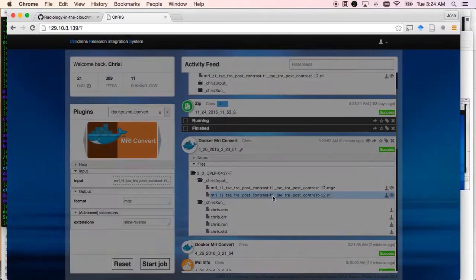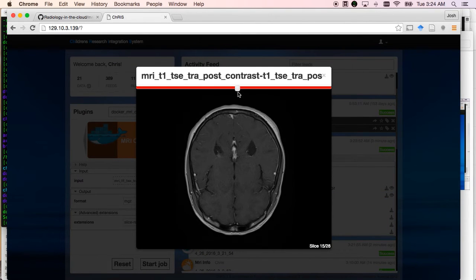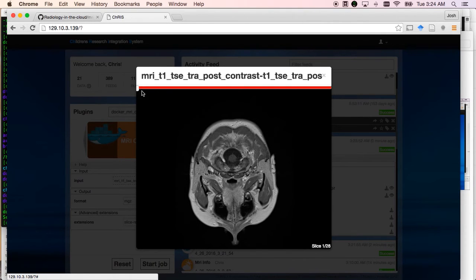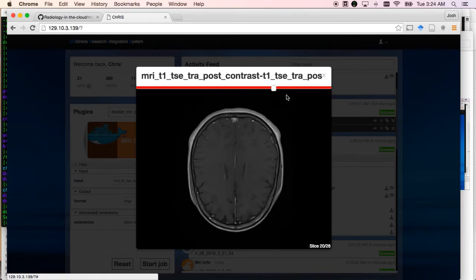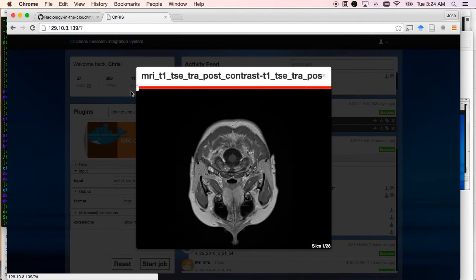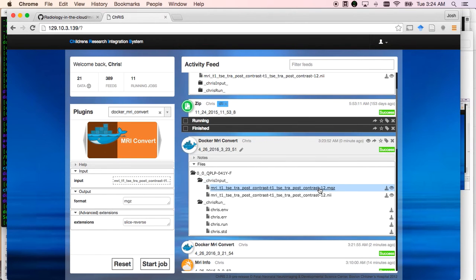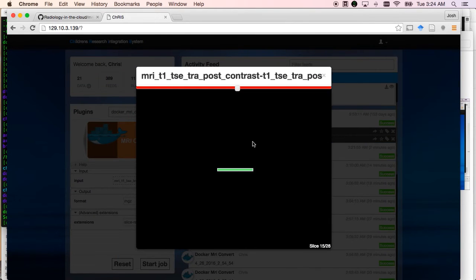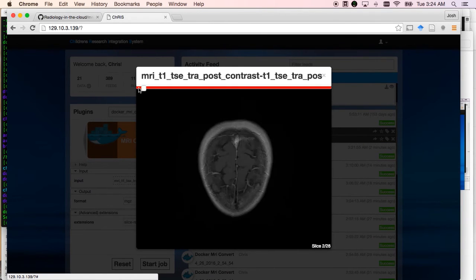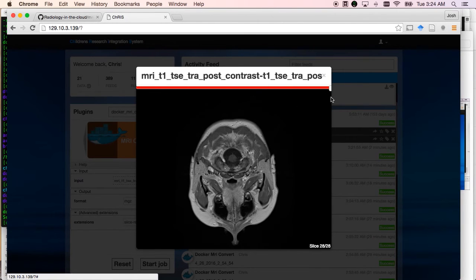And so again, we have our starting MRI. Now to walk through this from the bottom of somebody's head all the way to the top. Again, just remember that orientation. Bottom is to the left, top is to the right. But in our output file here, top is to the left, and bottom is down to the right.